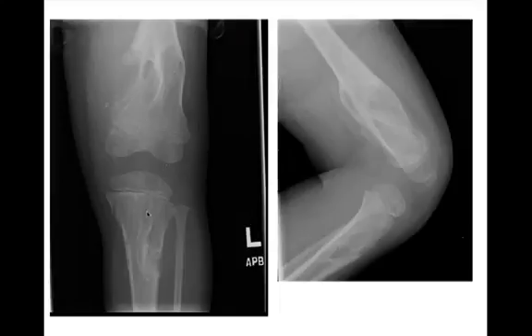They have this very typical appearance. They're always going to tunnel from the physis into the bone, again from the physis into the metadiaphysis. So if you see this, this is really pathognomonic for multiple enchondromas in a patient. I don't know if they had Ollier's or Maffucci, which one it was, but multiple enchondromatosis.